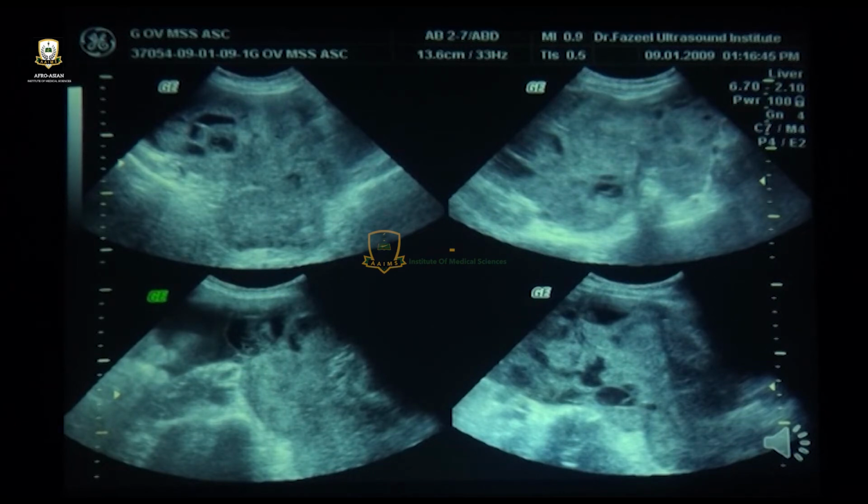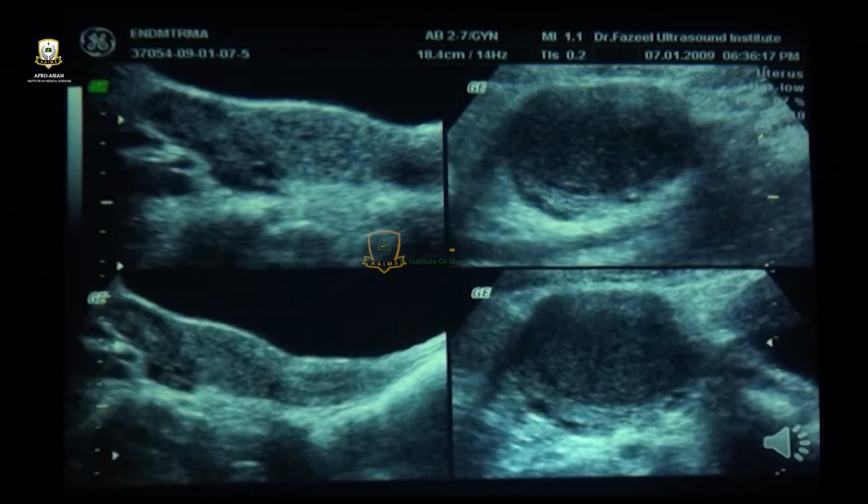Now you see a large ovarian cystic mass which is mostly solid with few cystic areas. This is typical of a highly anaplastic, poorly differentiated ovarian carcinoma. Whenever the cystic part is too much and the solid part is less, that would be a well-differentiated carcinoma. And this one is highly anaplastic, rapidly growing, associated with ascites. There is ascites, turbid ascites.